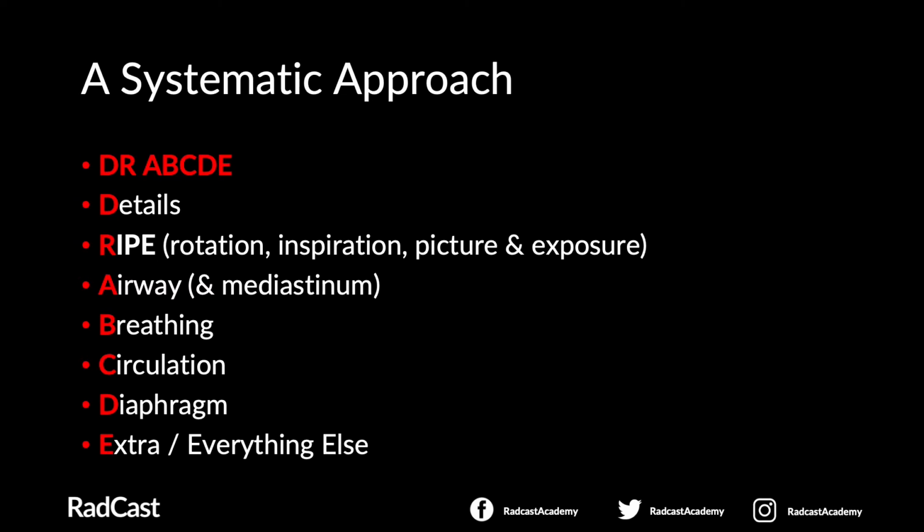There are many approaches to assessing the chest X-ray, and you may already use a system that works for you. Here, we are going to present the Dr. ABCDE method for assessing a chest X-ray, which you may have come across as a student or a junior doctor. You may be familiar with the ABCDE method. However, adding doctor at the beginning provides a more complete way of assessing the chest X-ray.